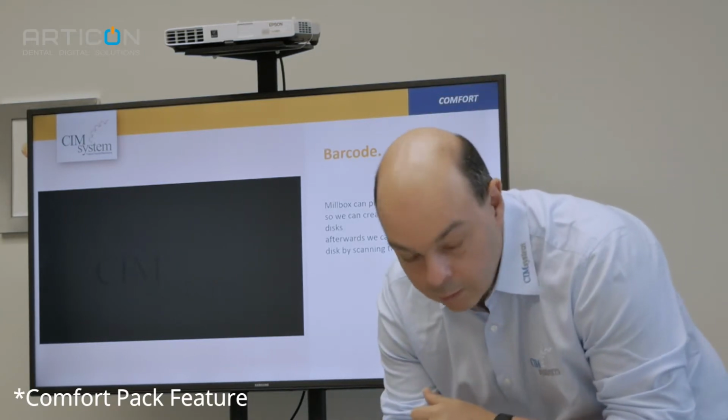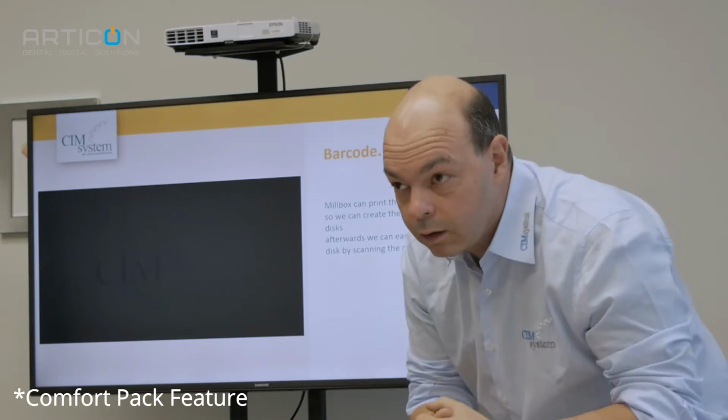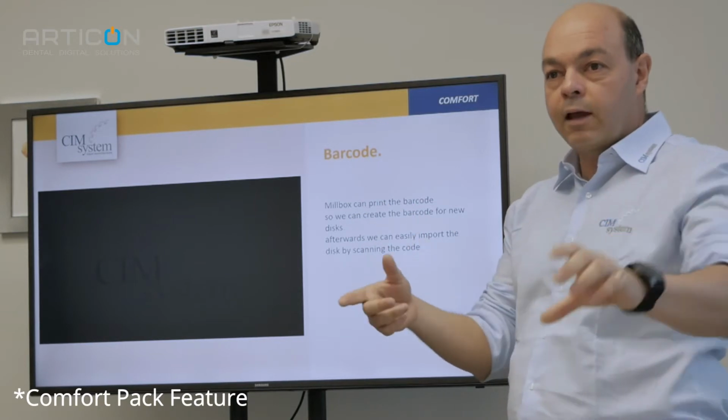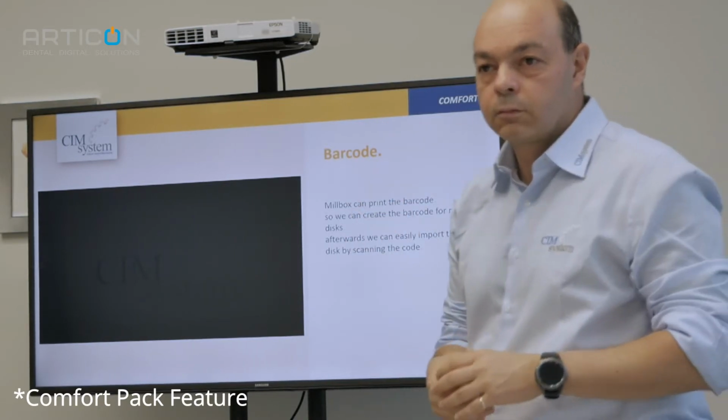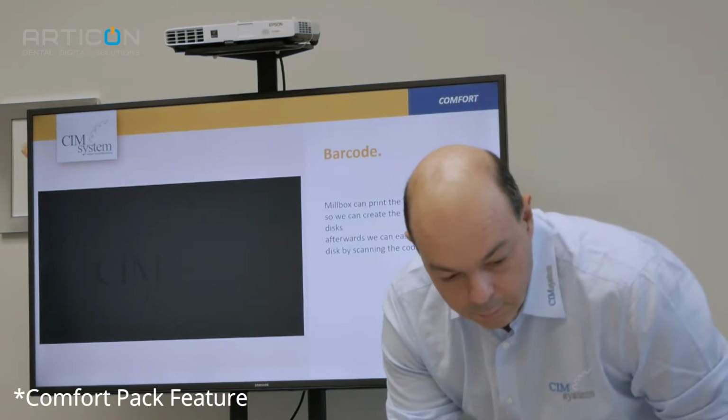This is nice because if you have many disks, it's easier to find and you don't need to select. You import the STL, you take the disk, you scan it, and automatically load the disk. Nice.